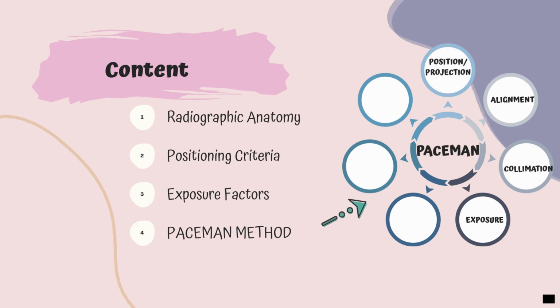Fifth criteria is marker, which is used to evaluate the evidence of the marker. Sixth is aesthetic, used to evaluate the correct film size or any evidence of artifact.